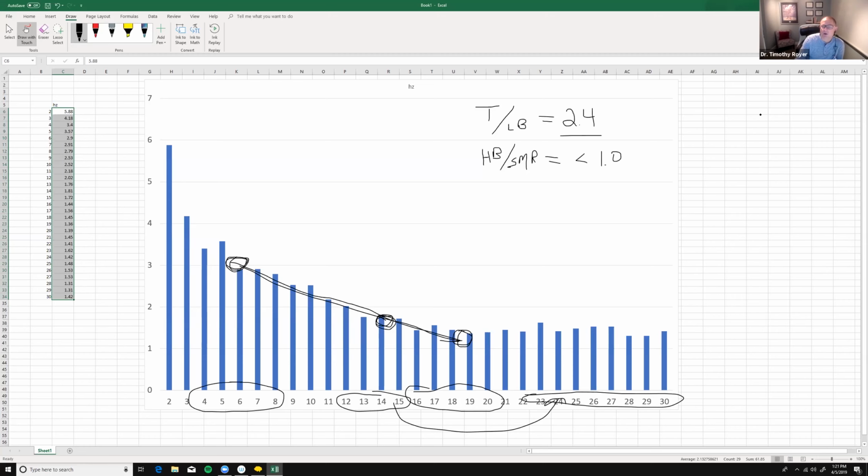That's actually going to be higher, and you saw that. You saw that mine was a 1.8, but the actual appropriate slope here from the SMRs to the high betas would look something like this, okay? And you can see when we look at my brain that my issue is not my thetas. My thetas are almost exactly where they need to be, but my issue is more in the high beta because these amplitudes are too high. You remember we saw the frequency stays the same, but the amplitudes can change.